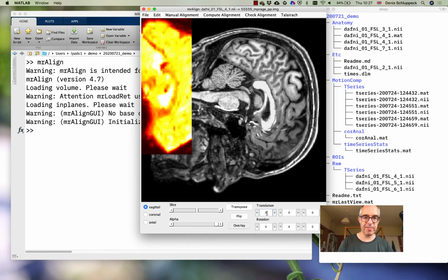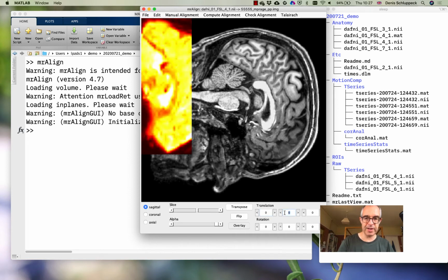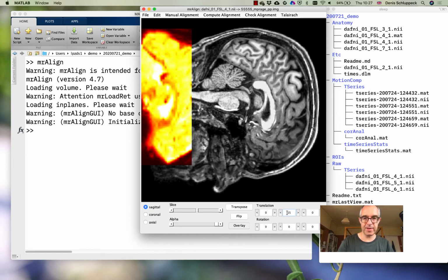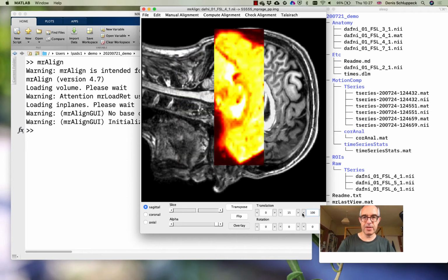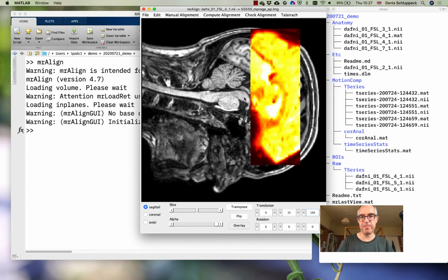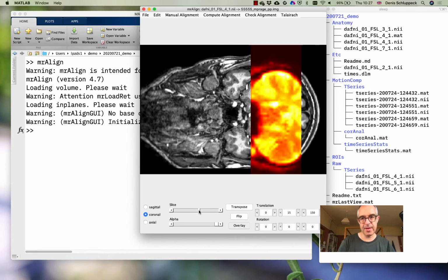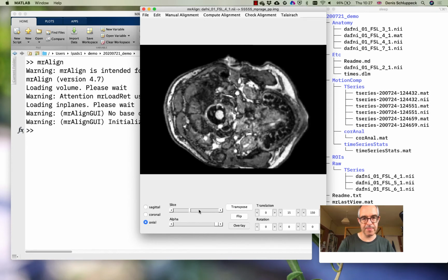And now you can play around here by transforming in this window by different pixels. You can explore what the actual orientations are, right? So the y direction points in this direction, so 15, and the z direction we probably need to add quite a bit, so maybe 50, 100. Usually this tool will pick up the correct alignment information from the scan, so we can switch to coronal view to see what's going on here. Right, difficult to see. Axial view, what's going on here.